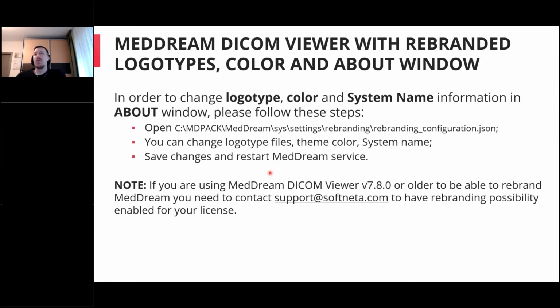And if you are still using previous versions, which we really don't recommend, we suggest updating to our newest versions. But still, if you are old school and use 7.8 or even older versions, by default rebranding was not enabled for them. If you would like to try it and change something here, you need to contact our support or sales team to have this rebranding possibility enabled for your license. But we would strongly recommend updating, of course.